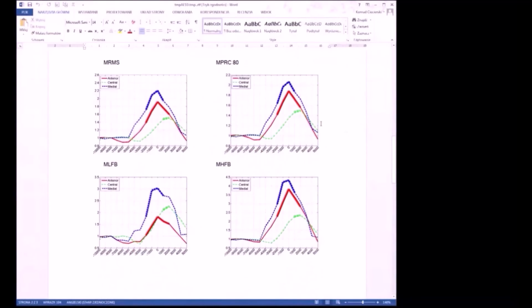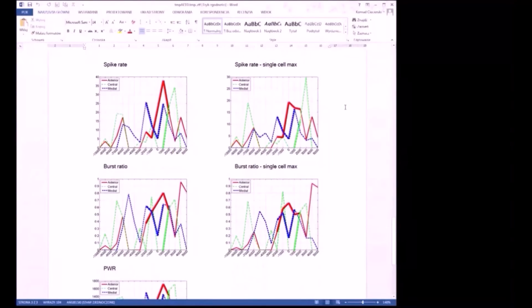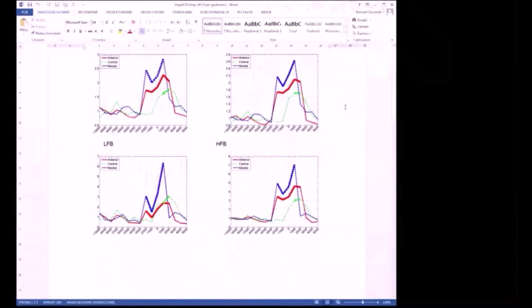Below, you can see the charts for the moving average of background attributes. Finally, the charts at the end are showing the spike-based attributes. You can see that the attributes that are background-based are much clearer and give much more evidence as to where to expect the STN to be than the spike-based attributes.